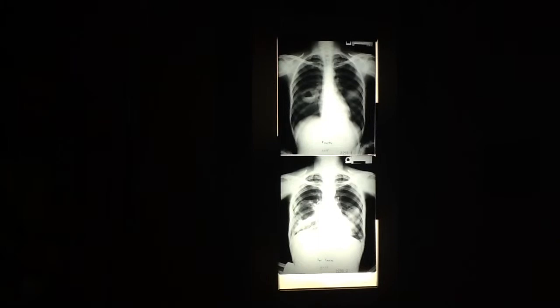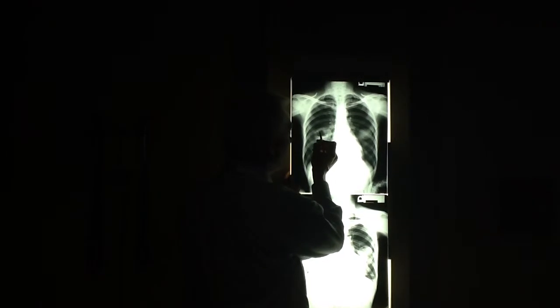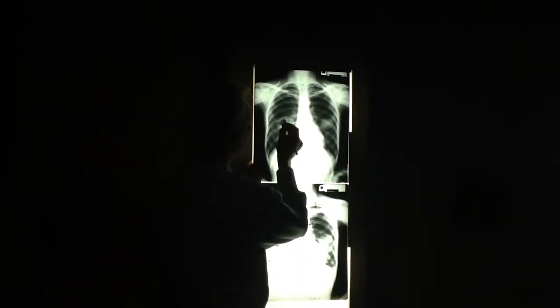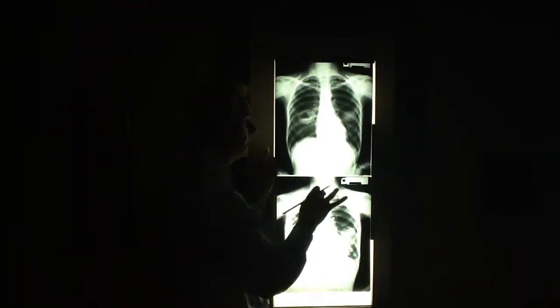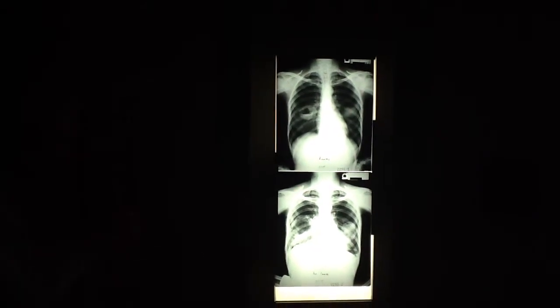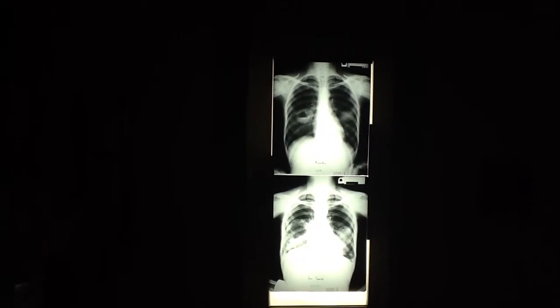Thick, fuzzy, or thick, more well-defined? Well defined. This is very well-defined. This is very thick. Now, maybe it's a little bit thinner here, but overall, that's a thick wall. It may be slightly irregular and a little bit nodular, but you can still pretty much define where this is. I would put that into the thick, lumpy nodular, well-defined inner, nice smooth outer. Definitely a thick wall cavity, isn't it?